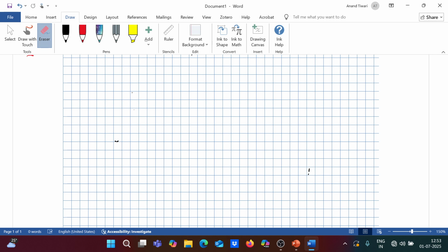Before moving to the pressure time curve scalar, I'll just show you the various graphs, which are various ways which you should know. So if we draw a baseline, you should just know these patterns of waveform. This is the square waveform. With the square waveform in the flow time curve, this is a constant flow in volume control. If you see this square waveform in the pressure time curve, it is a pressure control mode. So you can see the waveform from here.